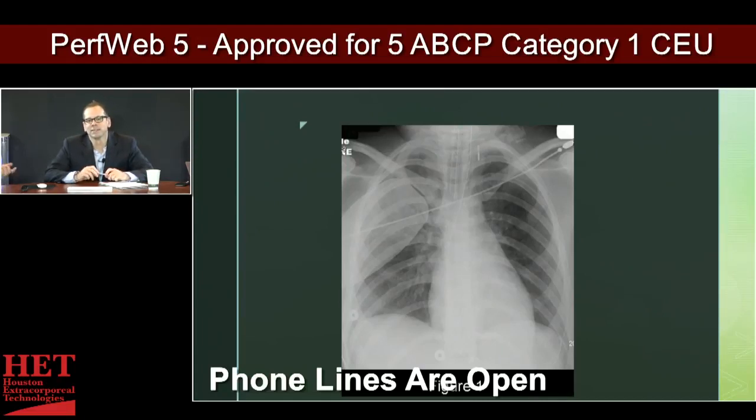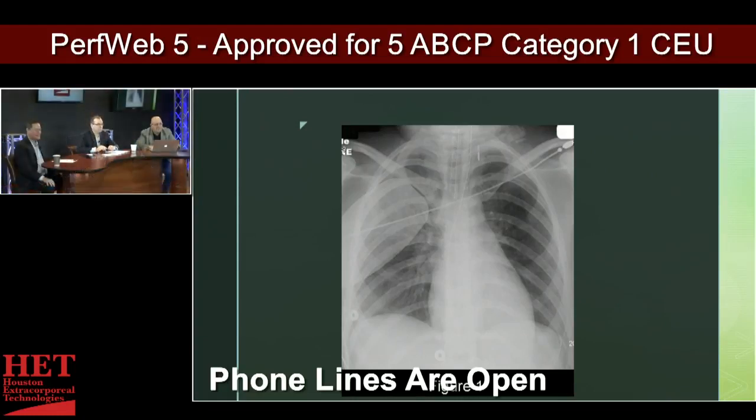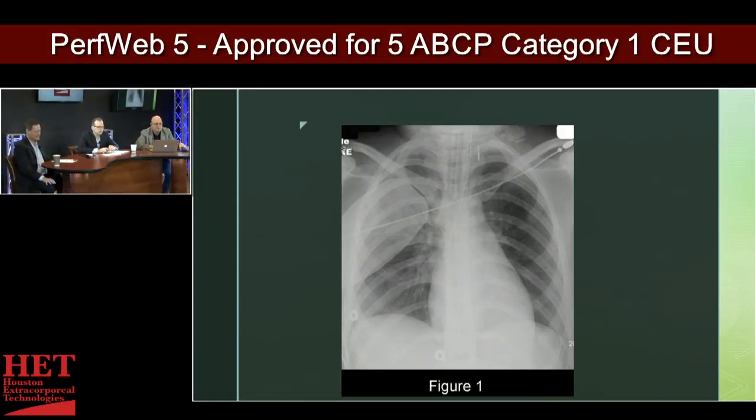I'm going to start with the process that you've been talking about. Let's talk about bone structure, and I don't see any damage to the bones. I don't see anything interesting there. To me, the heart looks slightly enlarged. Pretty much enlarged. So we have somewhat some congestive heart failure. The lungs look pretty good to me, but I see two things that stand out.